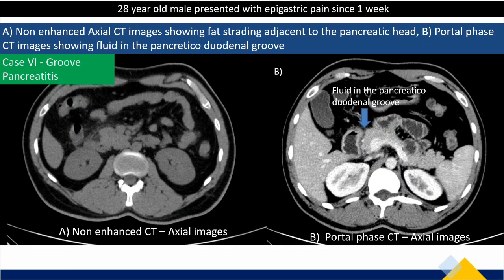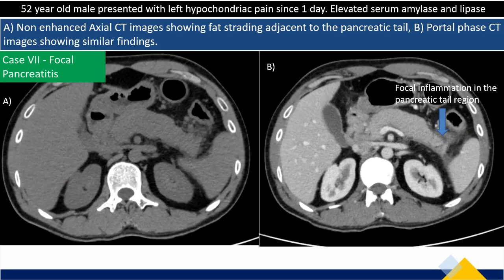28-year-old male presented with epigastric pain since 1 week. Non-enhanced axial CT images showing fat stranding adjacent to the pancreatic head. In the second image, we can see fluid in the pancreaticoduodenal groove. This is a case of groove pancreatitis.